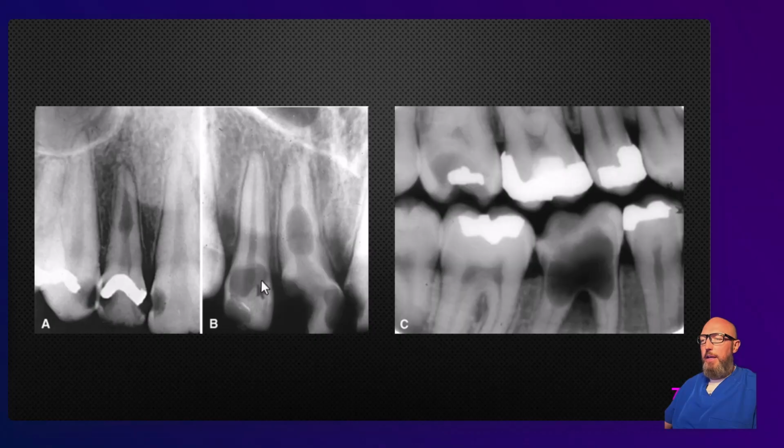What about this one right here? Well, that pulp chamber, the root canal space is intact, and so this is external. What it really looks like is a radiolucent composite, and you guys should be familiar with that at this point. Here's another example. Here it looks like the root canals just kind of end, but then they widen around this well-defined resorbed portion of the dentin.